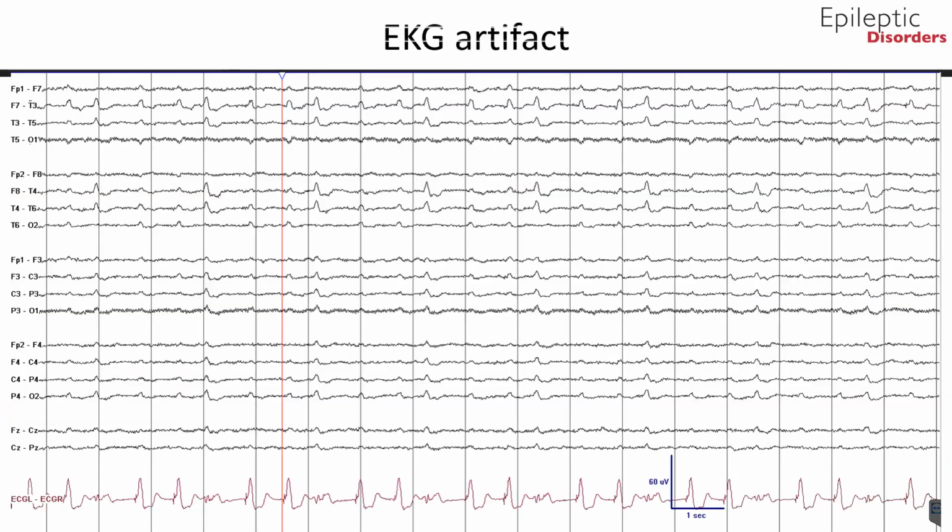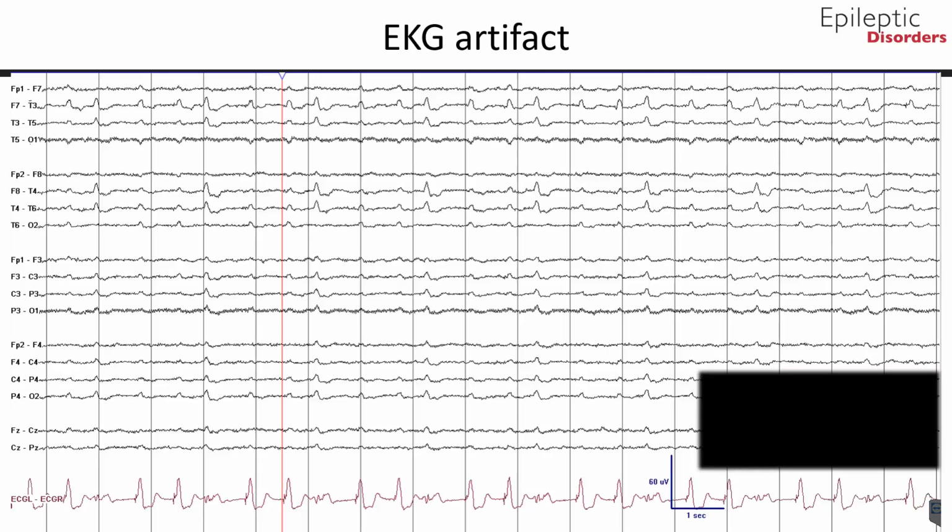The heart is another key source of EEG artifact and is variably present on recordings depending on the montage that is used and the size of the patient. Referential montages often accentuate EKG artifact. Overweight patients with short stocky necks as well as babies may be predisposed to EKG artifact because the dipole is situated close to the recording electrodes and is better able to transmit the current. Recording the EKG during routine EEG is essential to enable recognition of the cardiac-cerebral relationship.